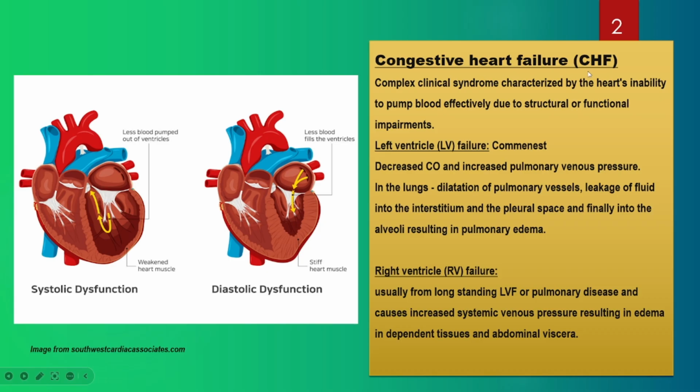Congestive heart failure is basically the heart's inability to pump blood effectively due to structural or functional impairments. I'm not going to elaborate on the clinical features, pathophysiology, or various types of heart failure, but I will concentrate on the information related to the radiological or chest X-ray findings. Left ventricular failure is the commonest.